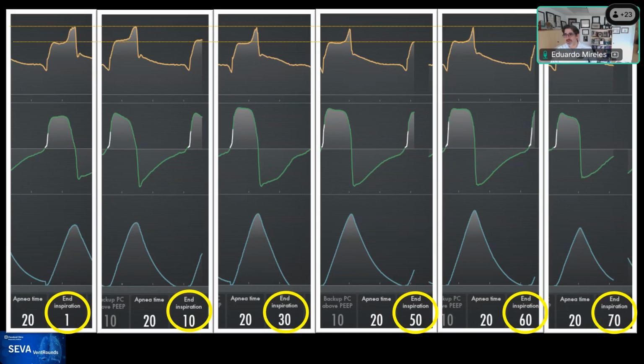So, I mean, I don't think that this is a solvable issue. The question is, would this be dangerous for the patient, A, to have that peak? And that's one of the questions. Should I be correcting it? Or is it a futile exercise on doing this and getting all the way there? So this is an actual patient. So I would like to hear your thoughts, Roberto, and obviously of the audience.